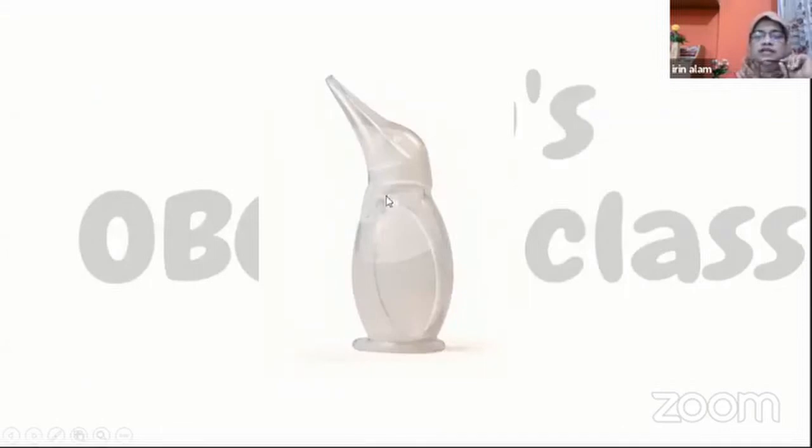Can you see this slide? This is a penguin sucker. It is used to suck the mouth or nose of the newborn if there is any secretion.